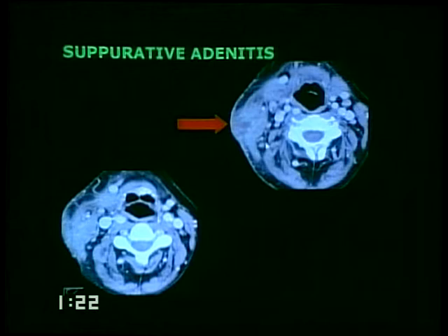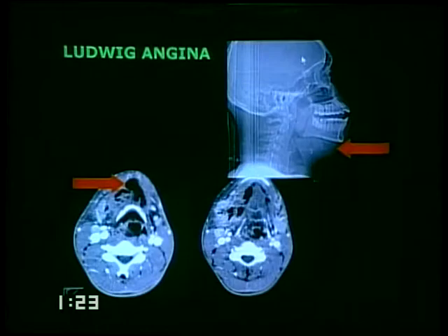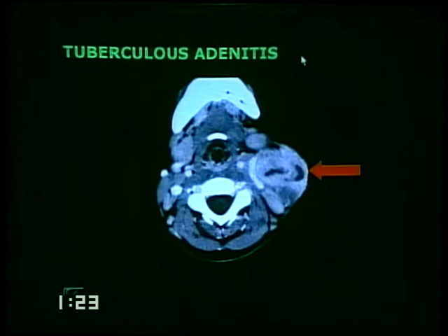Suppurative lymph nodes. These are not really abscesses, but they're secondarily infected lymph nodes. You don't quite have to drain them as yet because they're not a drainable fluid collection. They're just lymph nodes with liquefactive change associated with them. Too many lymph nodes. These aren't muscles, but there are too many lymph nodes in a location where we shouldn't have anything isoattenuating with muscles. Always think of lymphoma. This is quite unusual, streptococcal infection causing fascial emphysema.